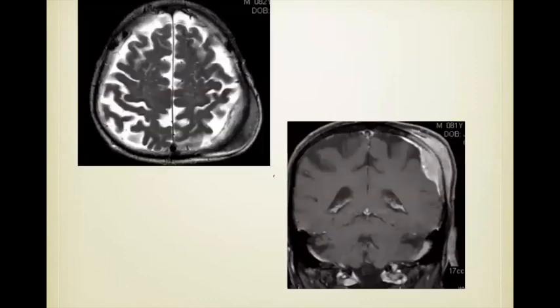In this category, I'm just going to talk about lesions that are on both sides of the skull. So very often you'll see lesions like this, where there's abnormal enhancement in the skull, a soft tissue mass inside the skull, and a soft tissue mass outside the skull. In fact, anytime you see something that's involving the intracranial compartment and the bone, look carefully for the subcutaneous involvement or subgaleal involvement.